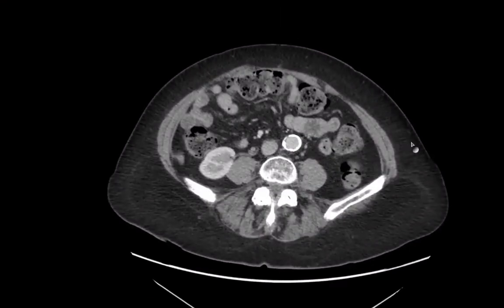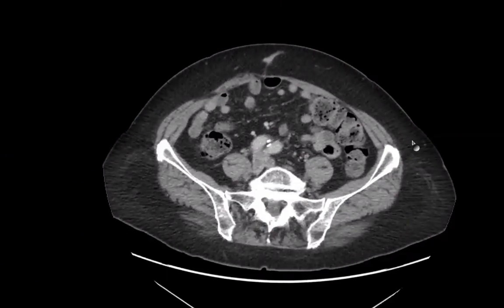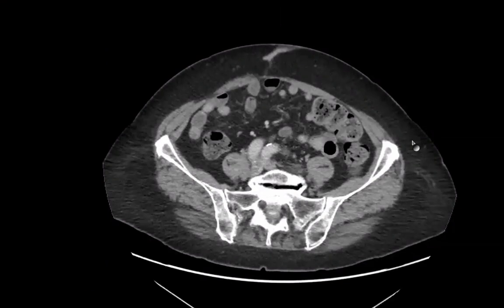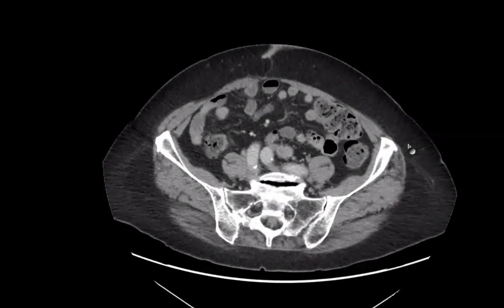Don't forget, I told you this patient has had an operation in a different country 5-6 years ago. So there are adhesions of the small bowel loops to the anterior abdominal wall on the right side. Only stop me if you see deposits. This is how you train your mind and neurons to look for the thing you're looking for, because if you get distracted by bowel loops and adhesions, you develop satisfaction of search. You found something, but actually look for deposits.